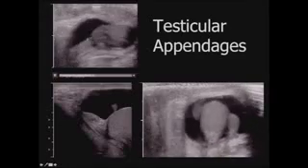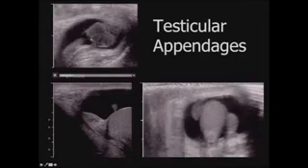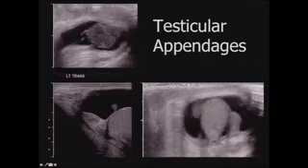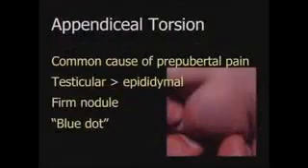You can see the testis or the appendage epididymis and testis right next to one another, which is why clinically you really can't tell them apart. And when you've got a little bit of fluid, you can see these little tiny things floating in hydrocele fluid. So when they torse and infarct, they become very, very focally painful. And if you're a very good examiner, you can determine that there's focal pain rather than diffuse pain as in testicular torsion. But that's non-trivial for even a fairly experienced examiner.